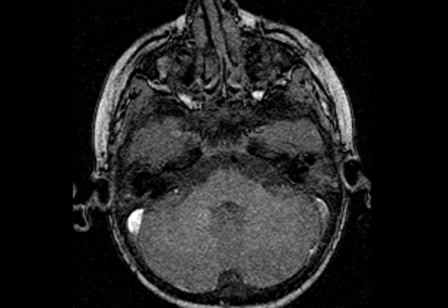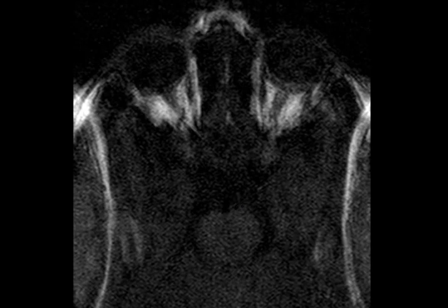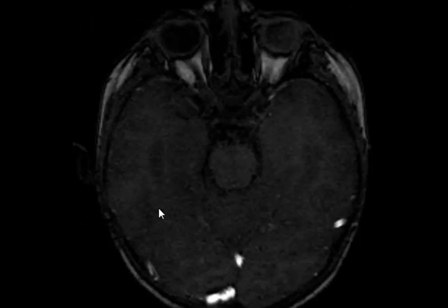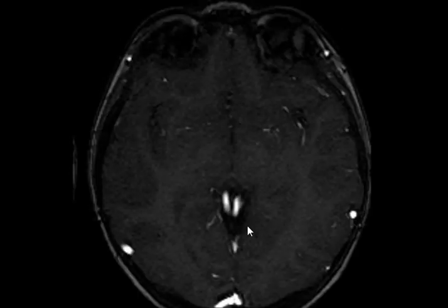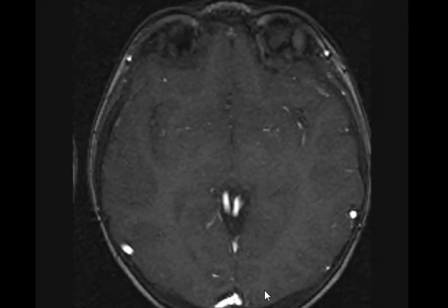Let's see this one. The child is moving here, so you see the image is blurry. Let's see this one. You can adjust the window wheel. Just press on the wheel and you can make it lighter or darker. No, press and move. Wheel. شيرين. الويل. Press it. Press. Move. Okay. تمام.